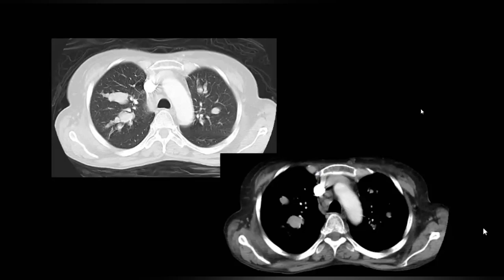So can you tell me why this patient does not have cystic fibrosis? It's because in cystic fibrosis, it's the same distribution. Yes, it's the same distribution, in the upper and middle zones, and the bronchi are not usually mucus filled. They can be. Patients usually die because of mucus plugging and recurrent pulmonary infection.